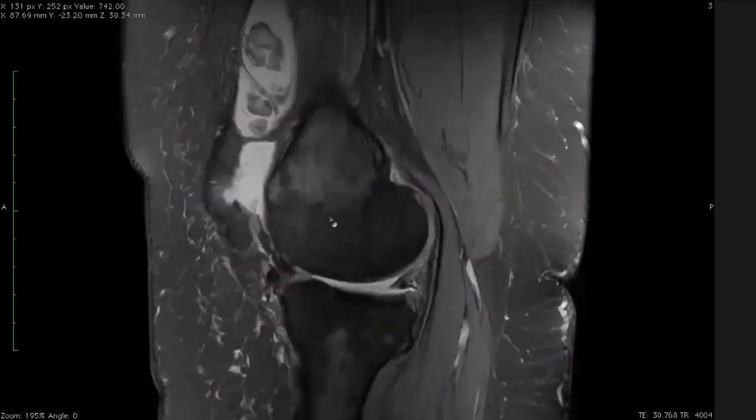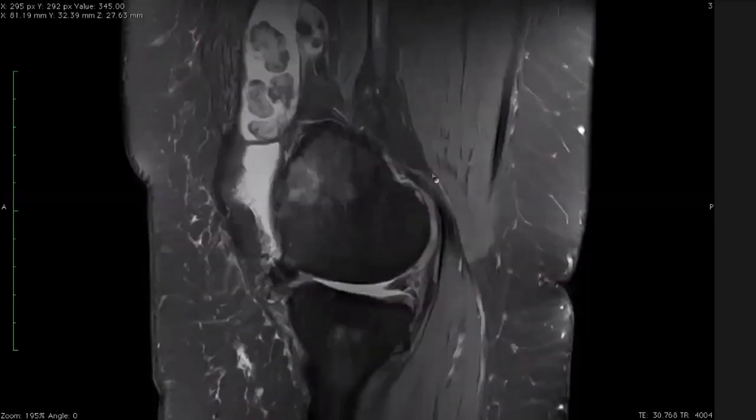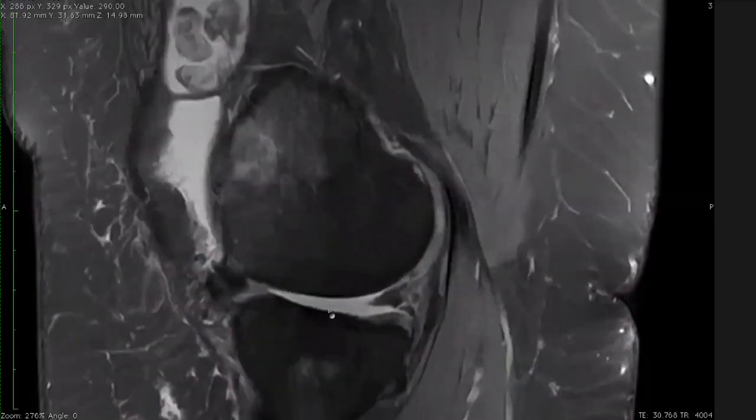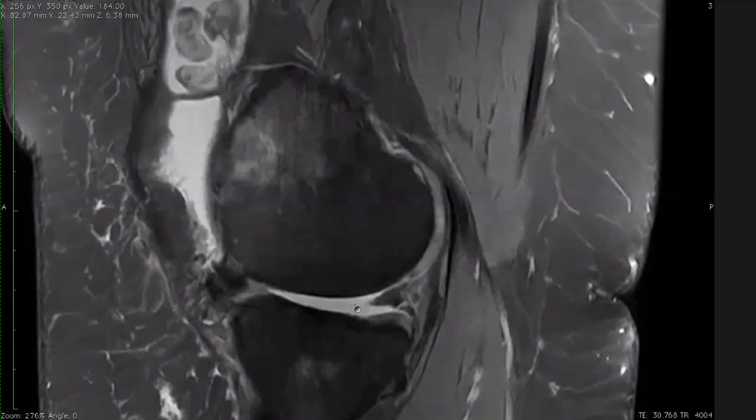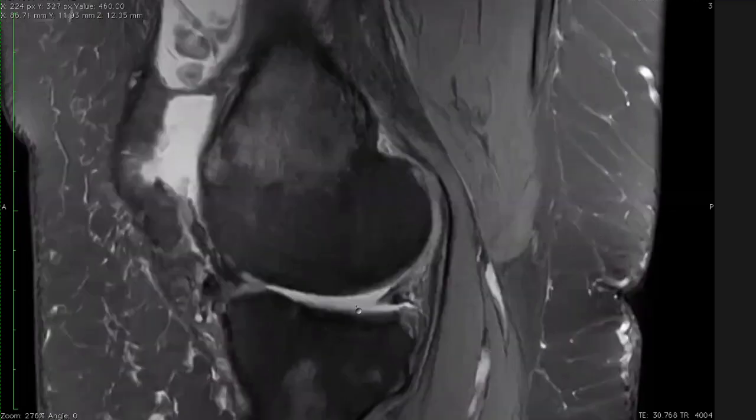Then we move on to the medial side. Where is the cartilage here? You can see the cartilage at the back. But what about the center? It is eroded. There's no cartilage there, isn't it? So how do we say that in our report? There's a discontinuation. Complete chondrosis.